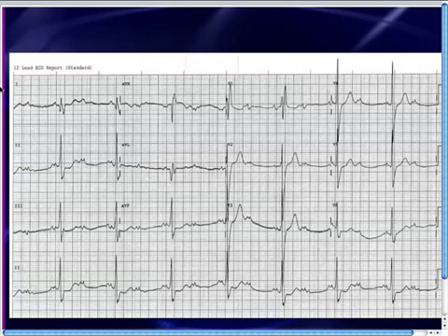And if this were third-degree AV block, then one thing that you would expect is that everywhere there's a PR segment, it should be changing fairly randomly. And you clearly see that the PR segments here are not changing randomly. So right off the bat, we can eliminate third-degree AV block. So that means that this must be second-degree AV block with 2-to-1 conduction.